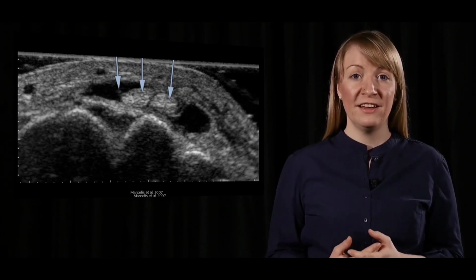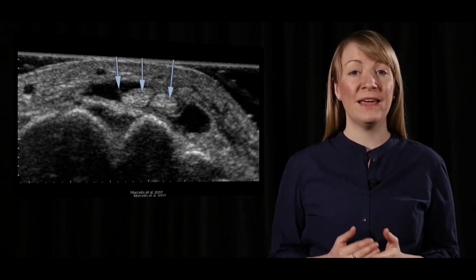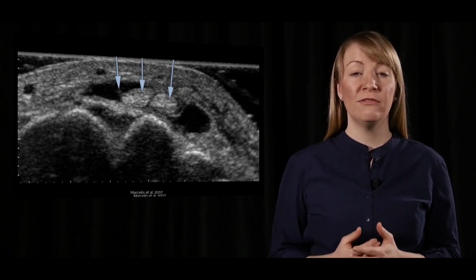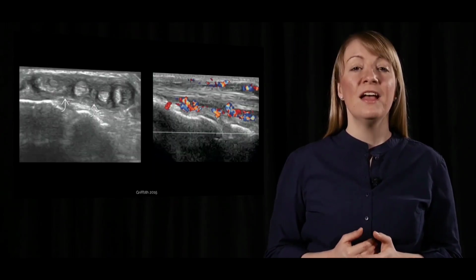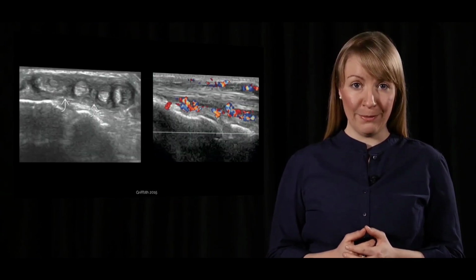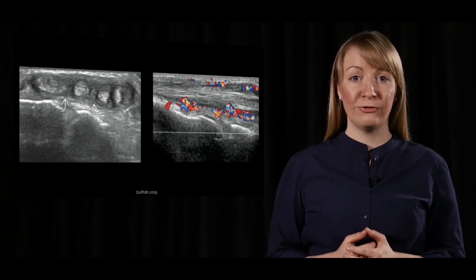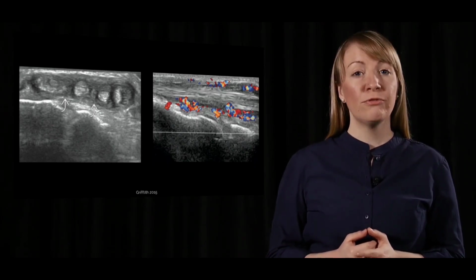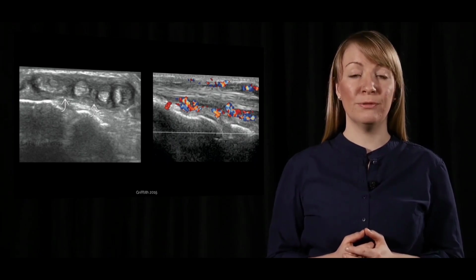Measurements of the tendon and retinaculum thickness and cross-sectional area have to be made to accurately document the pathology for diagnostic and/or evaluative purposes. This slide shows the fourth compartment of the wrist extensors. The left image shows a transverse scan of the compartment, the right image a longitudinal scan of one of the extensor tendons from the fourth compartment.